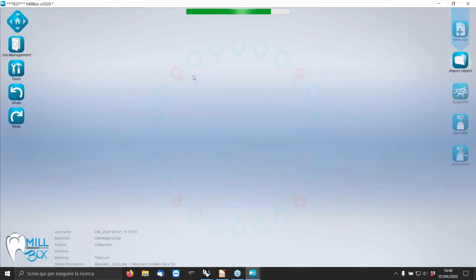This kind of work will be analyzed in a different webinar by my colleague Giorgio. But just to show you, as we've seen before, we can use many different kinds of replace system. Okay.